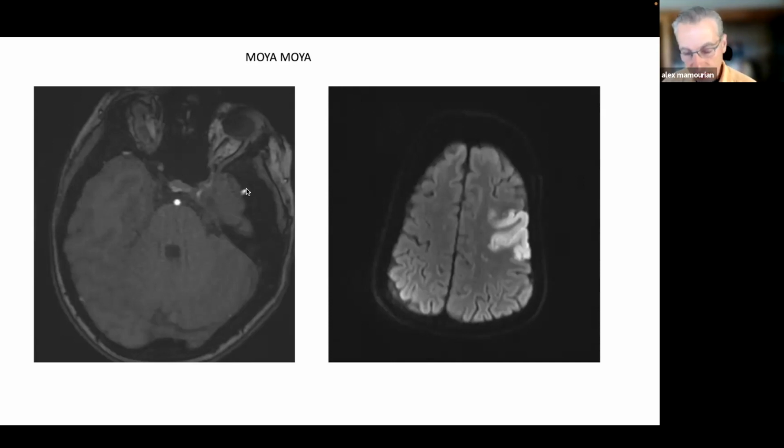It's because the brain is starved for flow and is using the middle meningeal artery as a source of flow through these network of collaterals to provide some flow to the brain, obviously not sufficient to avoid this infarct, but again, an unusual, but still it adheres to the concept of the external branches can support collateral flow to the brain.